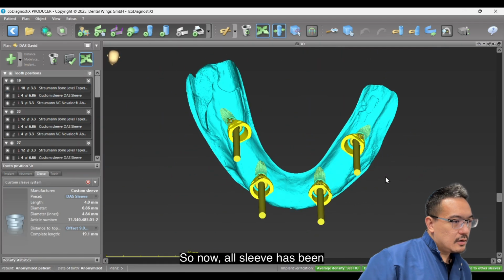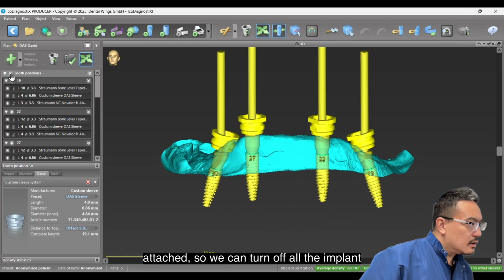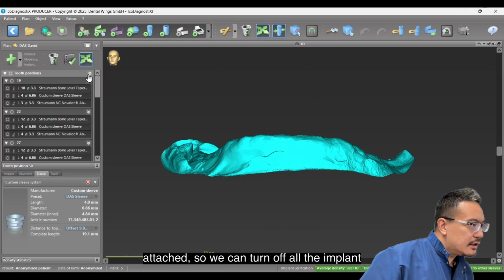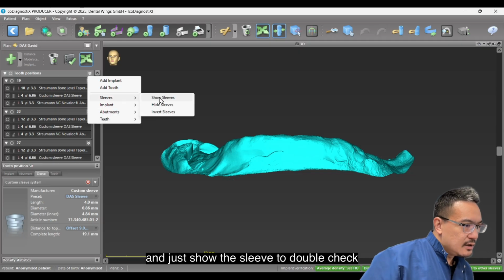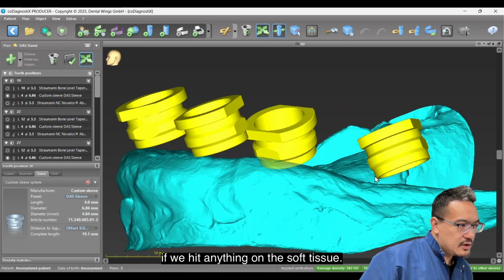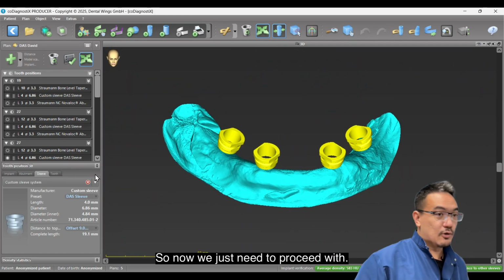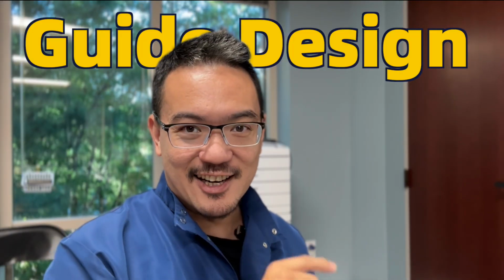So now all sleeves have been attached, so we can turn off all the implants and just show the sleeves to double check if we hit anything on the soft tissue. If not, then life is good. So now we just need to proceed with guide design.